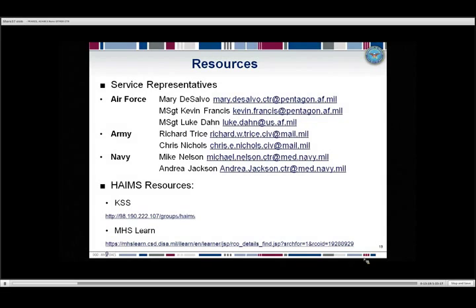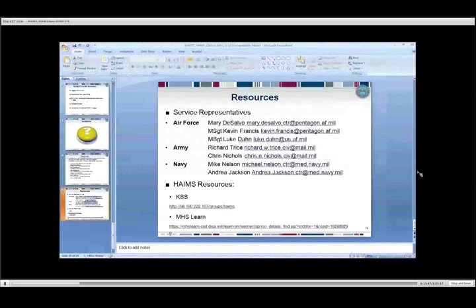Down at the bottom you see MHS Learn. If anything that we go over today you'd like to see again, you can go to MHS Learn and access the HAIMS computer-based training module. And there are short video clips, 5 to 7 minutes long, that, for example, if you wanted to see how to associate an asset to an encounter, you could watch a video to show you how to do that. So now we are going to go ahead and move over to our AHLTA.